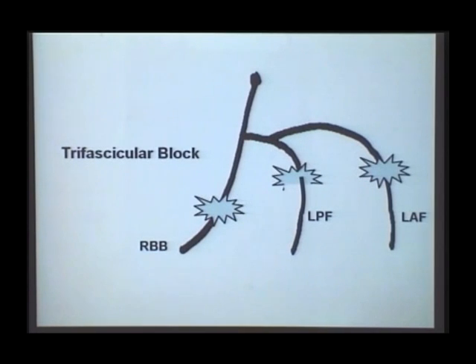You have to give the patient a pacemaker immediately at this point in time. Or you find an AV block. For example, RBBB is there, LAFB is there. Intermittently one P wave is blocked. Two P waves are getting conducted, one P wave is not followed by a QRS complex. Three P waves are getting conducted, one P wave is not followed by a complex. What does that mean? The left posterior fascicle is intermittently blocking one of the P waves. That means it is partially blocked.